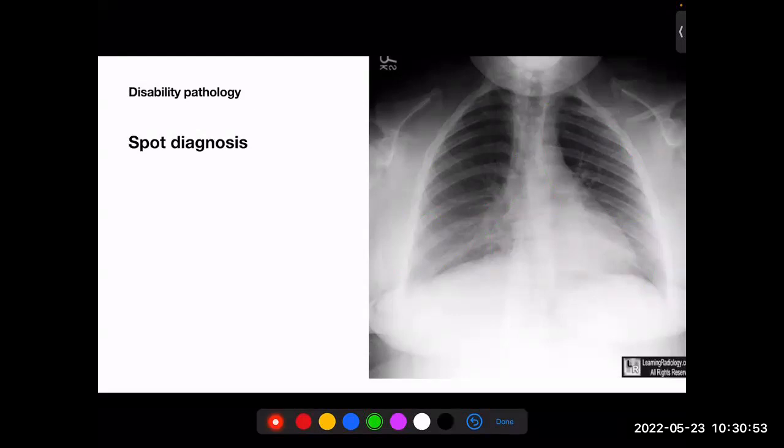There are these small rib lesions, but I'm not looking at those. Look at the clavicle on this side. Are you seeing a clavicle here? Absent clavicle. You are not looking, so you are not seeing.